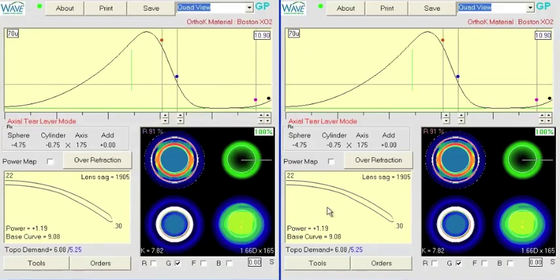And okay, so now we have the same patient again in both windows. So with glare and halos, in order to increase the size of the optic zone, I've actually discovered that changing the OZ and the IC don't seem to help that much. And I'll show you an example here. Right now we're at 6.2 and 6.8, I'm presuming.